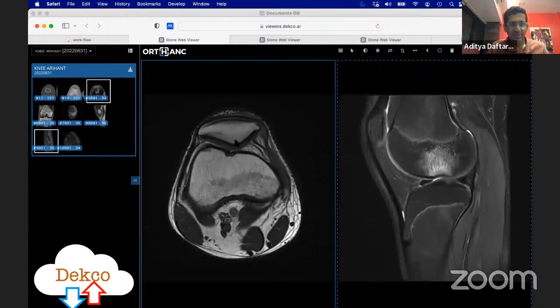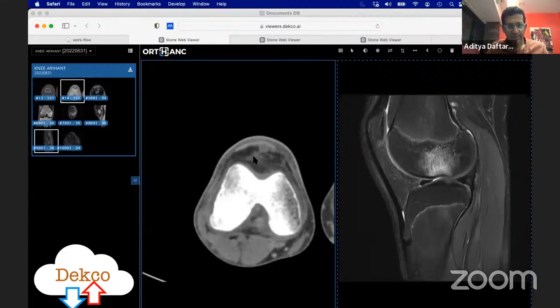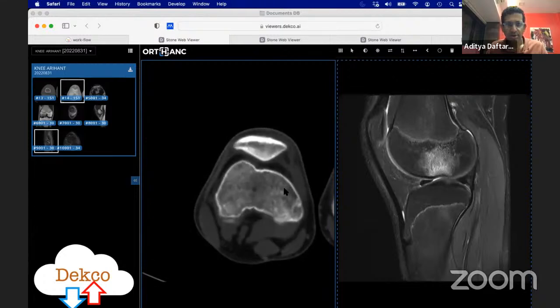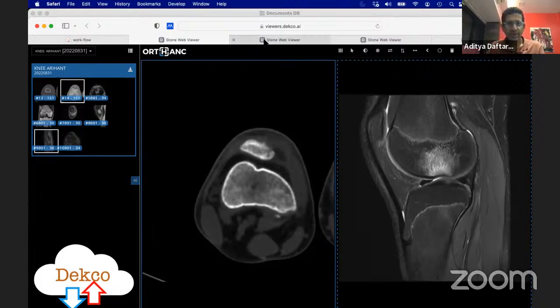Sometimes some people will do CT cuts on these patients. As you look at the CT images here, you'll start to see some element of bony remodeling at the inferior pole where that dislocation happened. So it's just an impactional change that you have there. So this is one thing that we would see.